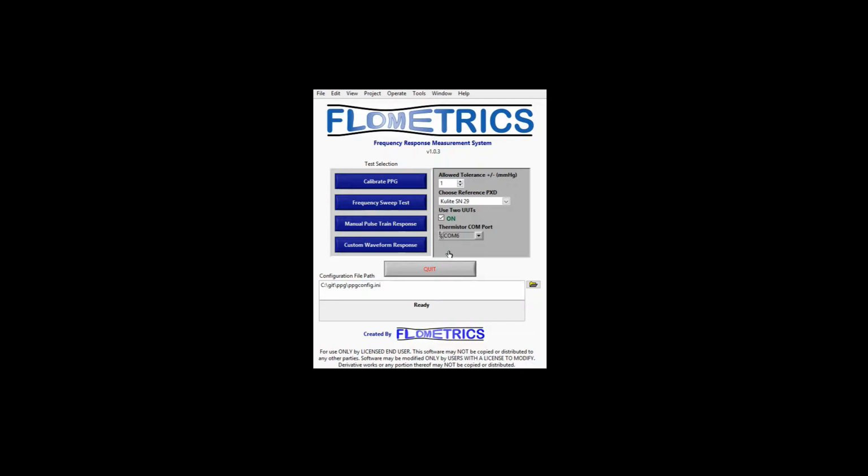Custom Waveform Response. The Custom Waveform Response function of the FRMS allows the operator to load a custom waveform shape, such as a heartbeat, from a text file. The operator can then send this waveform to the PPG and record the response for later analysis. To start the custom waveform response, after calibrating the PPG, select the Custom Waveform Response button. Wait for the FRMS to perform additional self-checks.